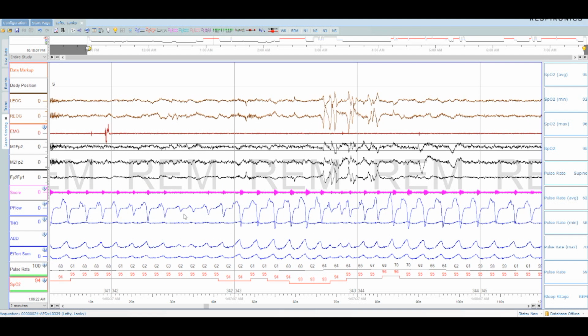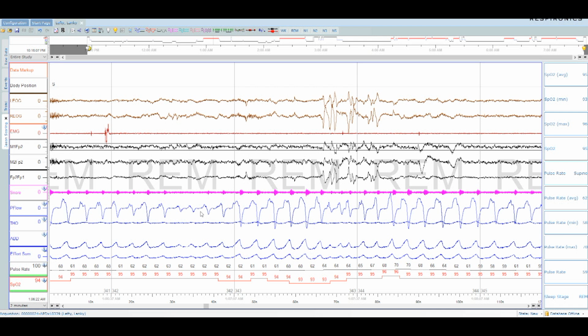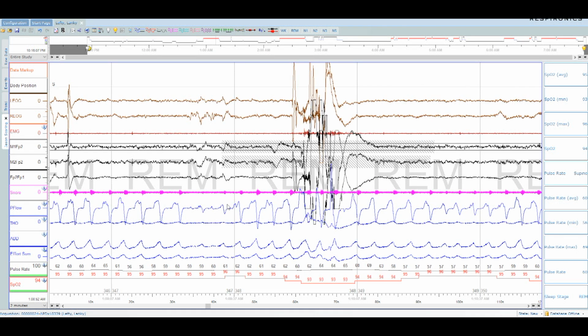So see, sometimes the machines will call these hypopneas or something. They'll call them RERAs. Because yeah, there's a 30% decrease in the flow. We have a 2% desaturation, but it can't be a RERA. There's no arousal. It's not a hypopnea because desaturation is not enough and there's no arousal. Machines will tag these, and what you'll also see is when people have this on APAP, that the machines do detect these as being a problem, and then you'll notice that when you're in REM, your pressure ramps up so high, so fast, that you'll wake up.